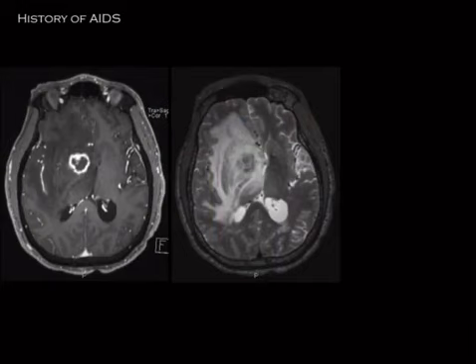All right, so here's another guy with AIDS, and point out a few things here. One, we've got a ring-enhancing lesion, and that in itself could be lots of different stuff, right? But then when we look at the T2, there is a lot of T2 hyperintense signal, way too much, right? Look, this thing's not even that big. Like, why would you have that much T2 signal abnormality? It's a lot of edema, right? It's a lot of edema. You may say that it's out of proportion. It's a buzzword, okay?